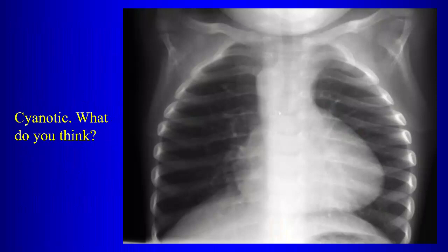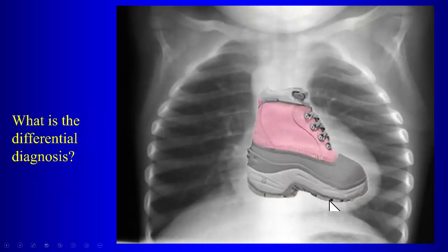Here, the pulmonary blood flow is decreased. I'm telling you, the patient is cyanotic. What do you think this patient has? Tricuspid atresia. It's possible, but I wouldn't start there. Why tetralogy of Fallot? You've got this boot-shaped heart over here, with the elevated apex and decreased pulmonary blood flow. So the boot-shaped heart with decreased blood flow, we know that that's going to be tetralogy of Fallot.